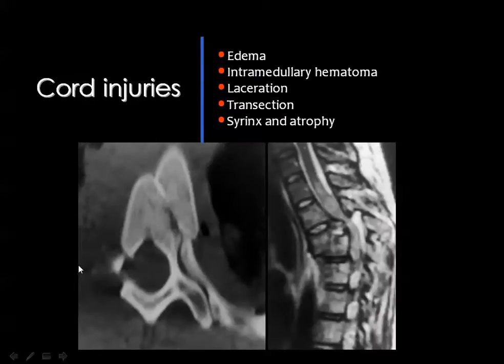Then this is the severe type of dorsal spine fracture with fourth degree spondylolisthesis of one of the dorsal vertebrae, which has become in front of the lower one. You see the marked deformity of the spinal canal with diffuse high signal intensity of the cord in T2 weighted images denoting the presence of cord edema. These are the possible lesions that can be seen in the spinal cord in cases of spinal trauma.